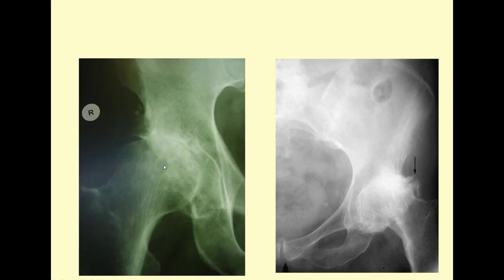Here we've got such a degree of joint capsule laxity that in this case, the femur head, when the patient's weight bearing, is beginning to move out, greatly increasing the teardrop distance. So there are some mechanical changes in weight bearing patients that can produce this. Now, if they were on the tabletop, relaxed, then the femur tends to relocate, and we would be able to appreciate not just the superior joint space narrowing, but the axial and likely teardrop reduction as well.